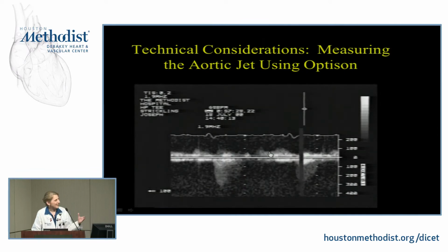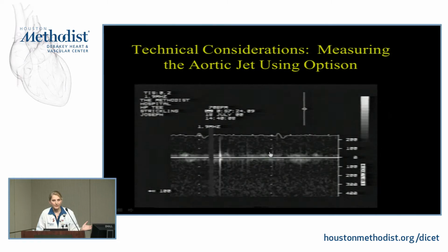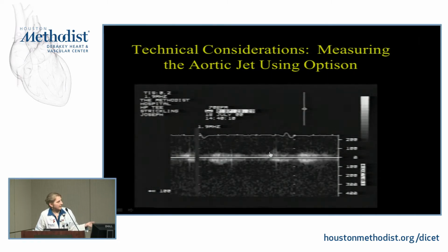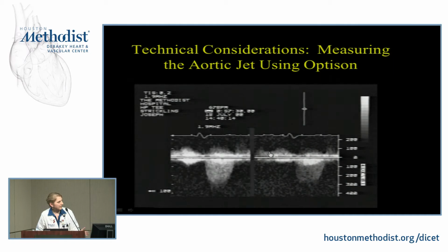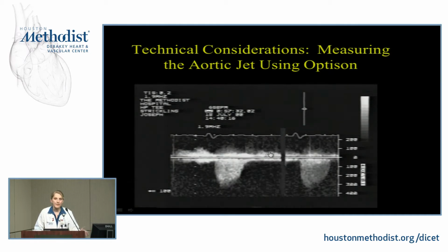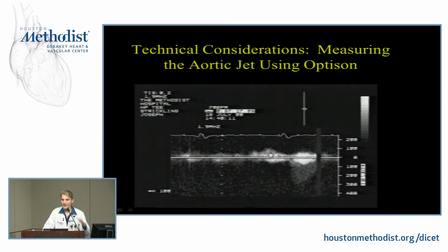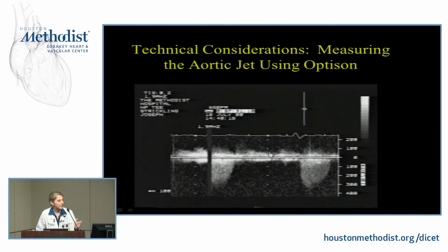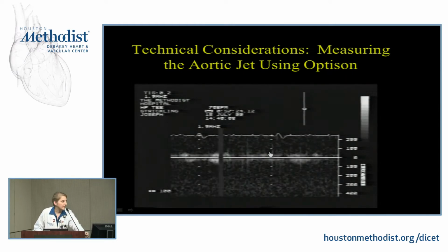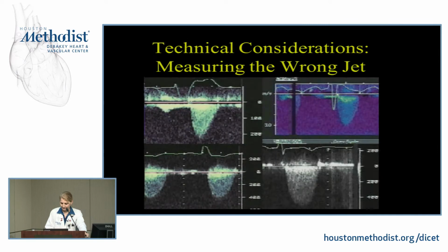Okay, thank you. So you can see in the very beginning that there's absolutely no signal whatsoever. And as the contrast comes in, there's a perfect contour, and you can clearly see the peak velocity. So that is something that you can use if you've tried and tried and tried with guided, blind, you just can't get it, please use contrast, because it does work in those very, very difficult cases to put you in the right ballpark for the stenosis severity.